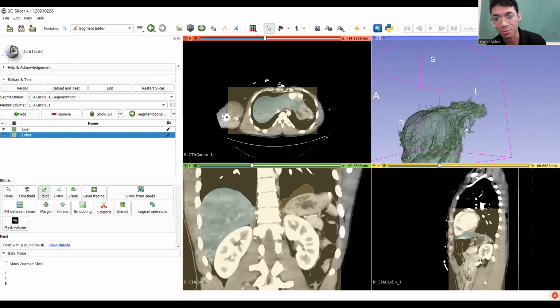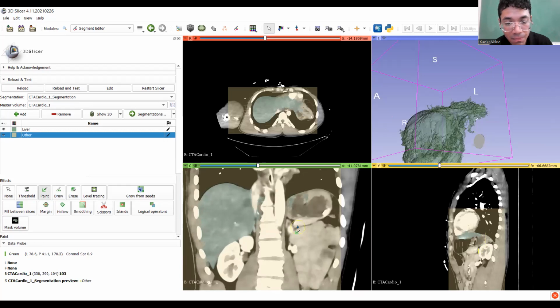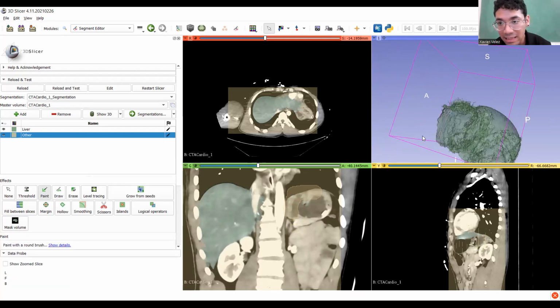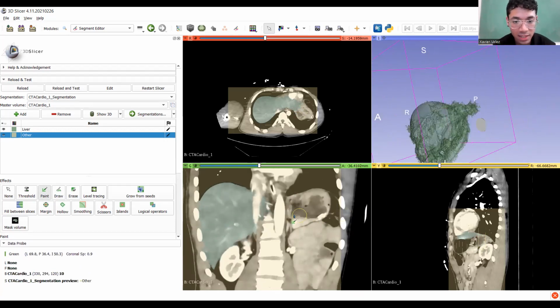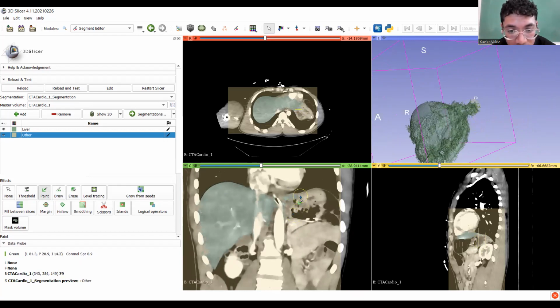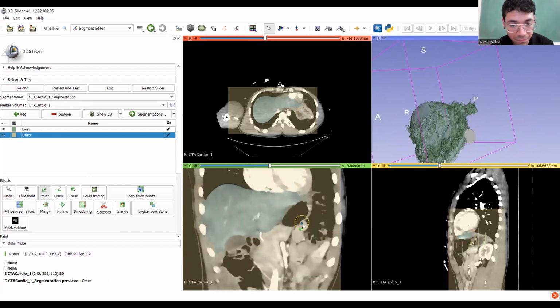well, not a whole lot of that stuff went away, but that's okay. That just means maybe we'll do a little bit more cleaning up around here. I can see there's more of that green here, so I'm just going to cover that, take that away, say, hey, get that out of here. We don't like that. So it's getting a little cleaner. It's still pretty rough, so let's see if we can take a little more out of that before we start finalizing things. I'm just going to go through that. And one thing to note is that it's never going to be clean at this stage.